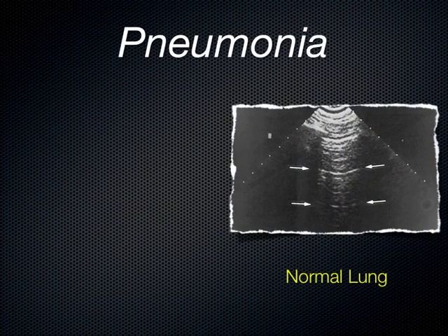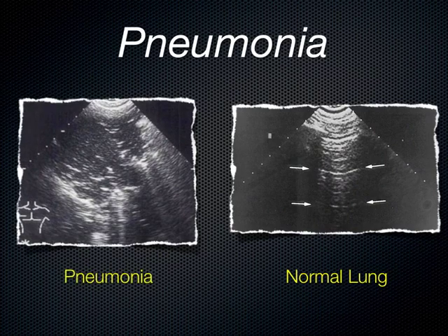So if you go in all 8 of your quadrants, basically, quadrant on both sides, you might be able to even say this is a right upper lobe infiltrate and compare that with your chest x-ray, because not everybody has full pneumonia on both sides, and it's a good thing. You might have one lobe affected on either side, and you can start to hone your skills by trying to find it and then comparing it to the chest x-ray.